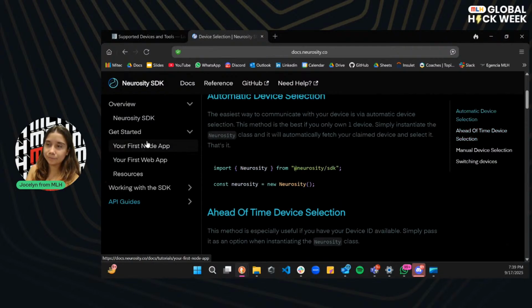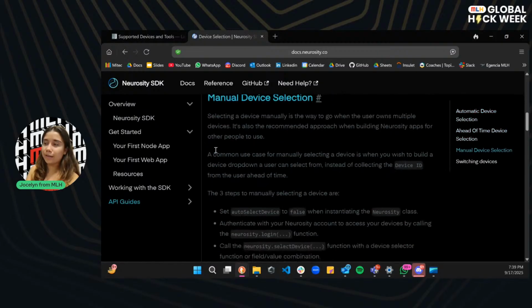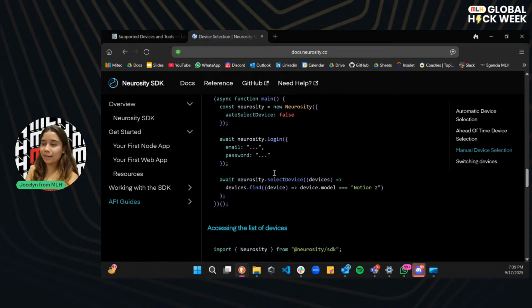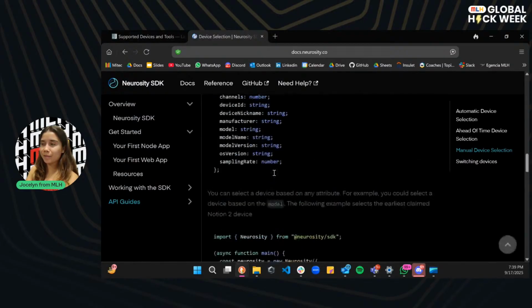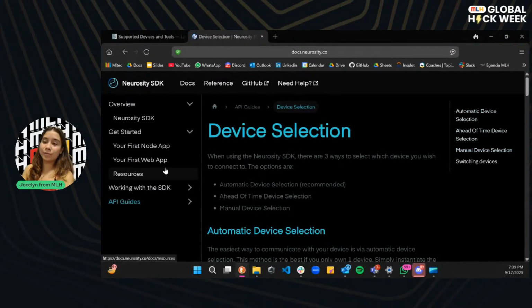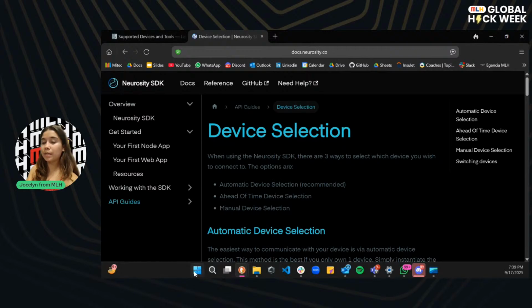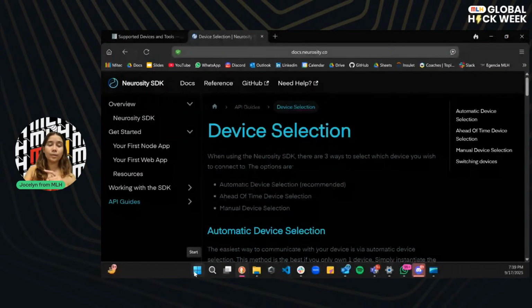I guess the hardest part is getting your actual motor imagery signals to work, because that was a pain for me. So for this stream, I'll be trying to use the live streaming layer so we can see if we can export those signals into Python so then we can work with them over there. And once we extract those signals, let me tell you, it's going to be easier because we can extract those signals and then import them into OpenVibe.